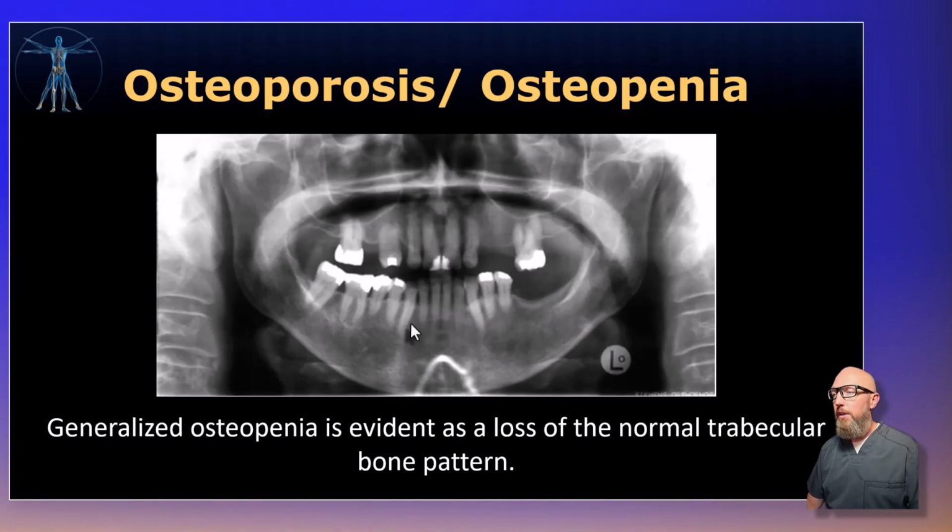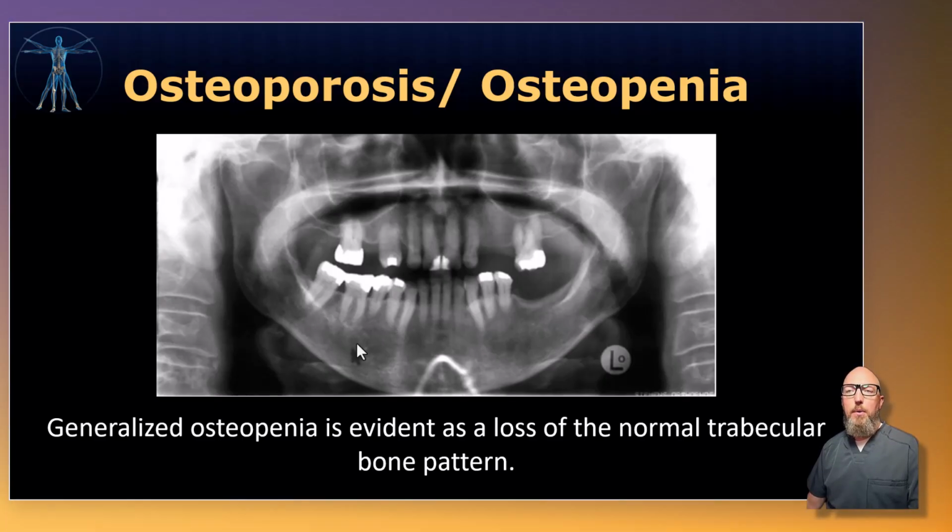And then what do you notice about the teeth? Well, the teeth themselves don't really have any malformities, but they kind of stand out against the bone. They're really prominent, and that's because of demineralized bone. That contrast effect is going to be a recurring theme here. So when bone loses density and the teeth don't, the teeth are going to look unnaturally bright.